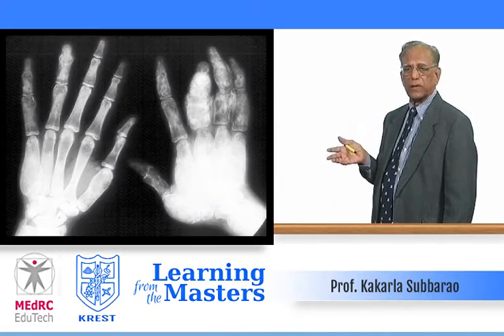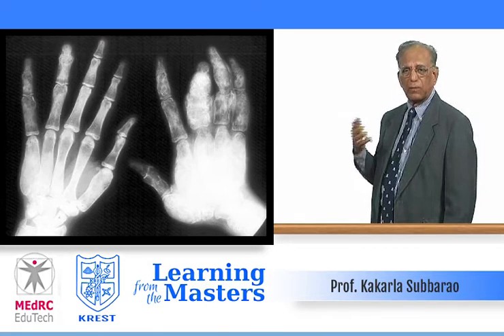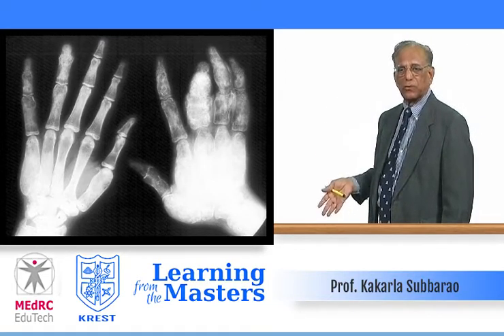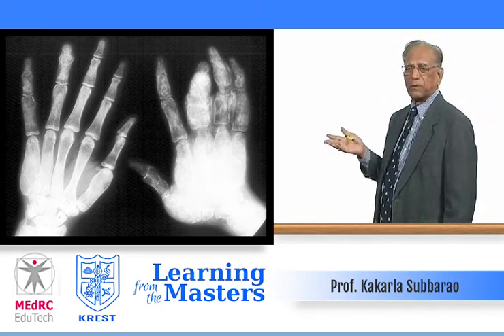And fibrous dysplasia could be monostotic, polyostotic, or the so-called Albright's disease, where it occurs often in girls with premature precocity of sex, and then unilateral distribution mostly, but although it may be asymmetrical. This is, for example, polyostotic fibrous dysplasia.